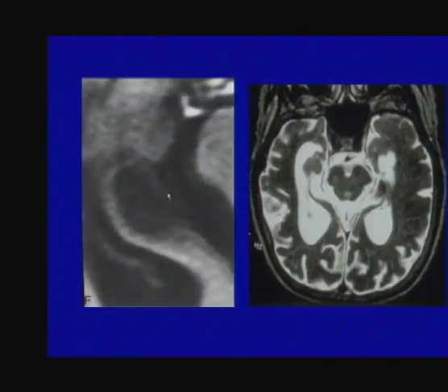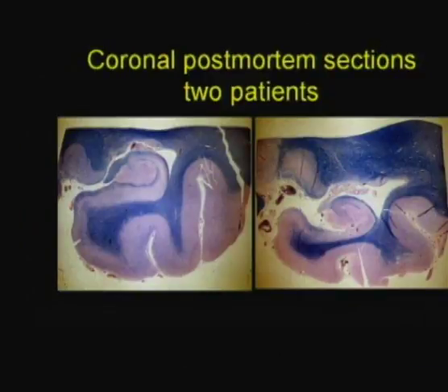You're going to see a marked enlargement of the transverse fissures on cross-sectional imaging. The temporal horns become large. The space between the transverse fissure and the temporal horn is what's left of the hippocampus. The hippocampus is a kind of sausage-like structure that winds around from the uncus area back and merges eventually with the fornices, and then eventually ends at the level of the mammillary bodies. This is what you're going to see pathologically on a coronal plane.